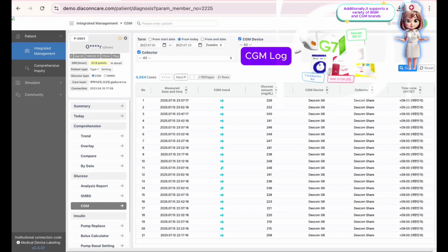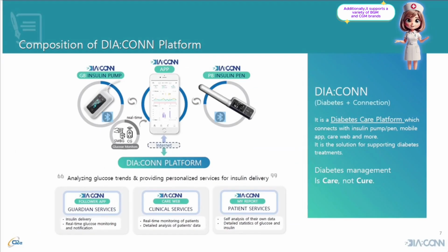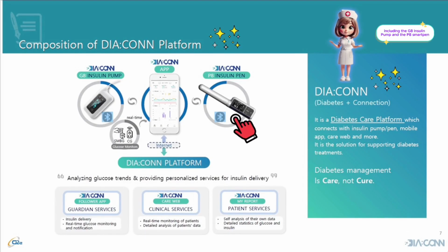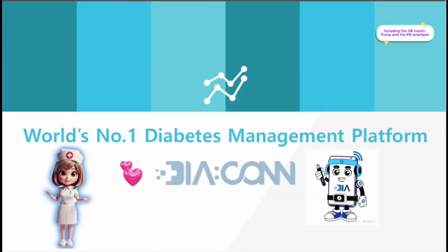Additionally, it supports a variety of BGM and CGM brands available on the market and can connect to and work intelligently with medical devices for insulin delivery, including the G8 insulin pump and the P8 Smart Pen.